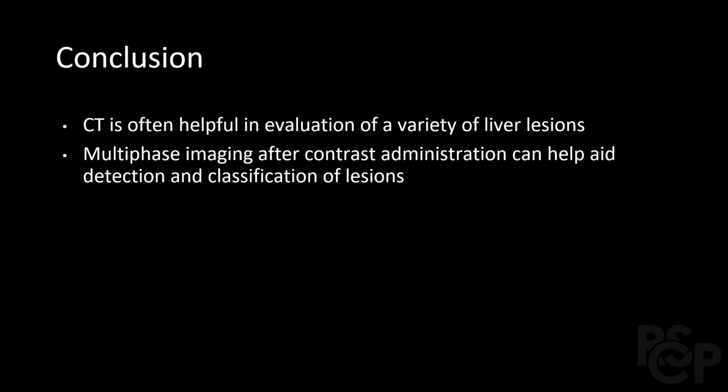To conclude, it is important to emphasize that CT is often helpful in evaluation of a variety of liver lesions, and that multi-phase imaging after contrast administration can help aid detection and classification of lesions.